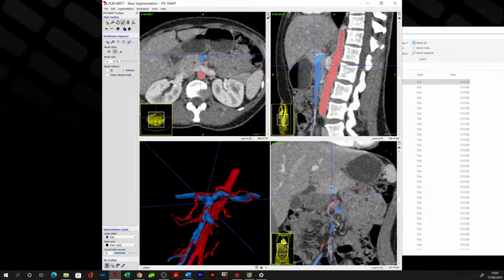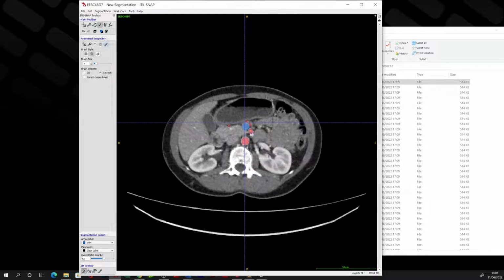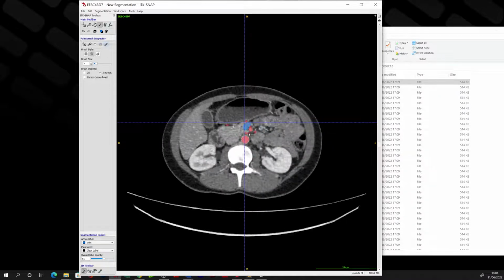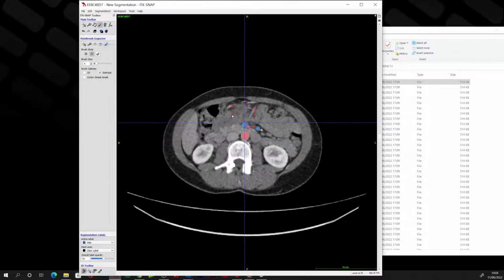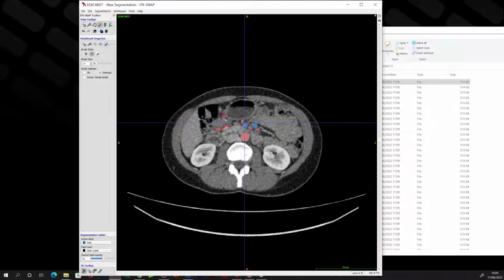Right, so let's get to the difficult part now, which is going to be identifying the structures of Henle's. I'll probably start with something relatively easy, which is going to be the GEV, because this is the most readily identifiable vessel that we have here. We'll follow this down. So that's the classic configuration.